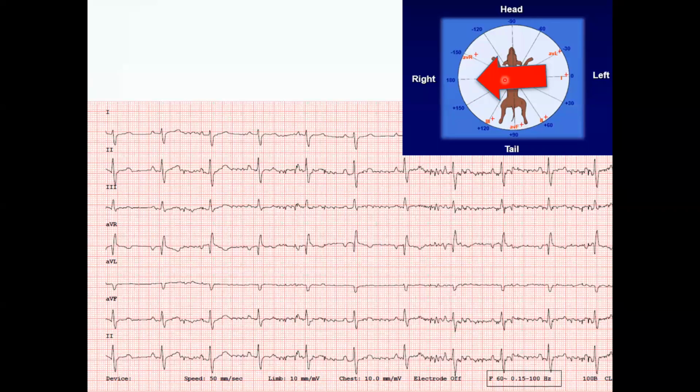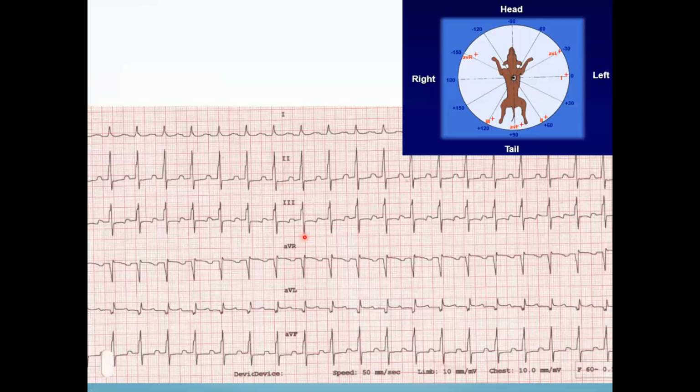And so another way you can check yourselves without having to do the isoelectric method, there's an even quicker method of doing it. You can simply look through all 6 leads and ask yourself, well, which one has the biggest magnitude deflection? It doesn't matter if it's a positive deflection or a negative deflection. Which one, when you subtract what's below baseline from what's above baseline, will give you the biggest deflection? And if we look at this example here, we look through our 6 leads. I think it's pretty fair to say that lead 2 would give us the biggest deflection. So again, we know straight away lead 2 is probably the mean electrical axis, and then we ask ourselves, is it positive or negative? In this case, it's positive, which gives us that vector.